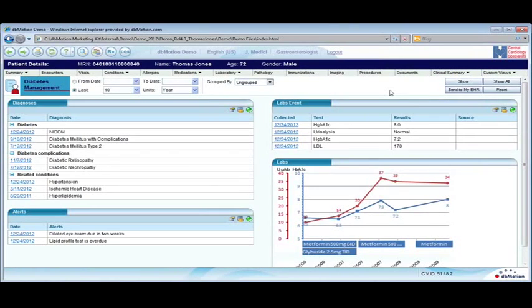So let me jump ahead here for a second, because I mentioned our ontology being the basis of this. Yes, Kate, is there a question? Yeah, Michael, I'm going to open up your line so you can ask this yourself. He hasn't had his PIN number, so I'll just read the question. Can you use the viewer of the PAC system to magnify, etc.? Yeah. So again, all we're doing is bringing up your own PACS view there. So we're doing that URL call.